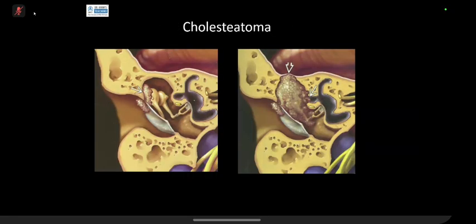Now, if you see here, this is the anatomy of pars flaccida. Our case was pars tensa. So this is the Prussak space, which is the space candidate. What was this? Candidate 4. This was candidate 4, isn't it? You did this case, correct? Yes, sir. Okay, your concepts were just mixed up between Prussak space and you were pointing out anatomy, which I'll show you later on, which was not what it was. So please concentrate on this case.